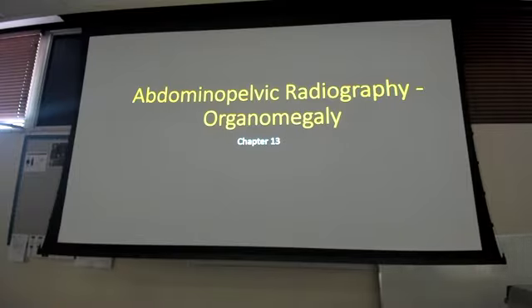Take over. So, anyways, how does this radiograph compute with micro? Pulls up a radiograph. Okay, what do we got here? What kind of fluke is this? Joke's on you, it's histoplasmosis. You should have seen it by the way it is.